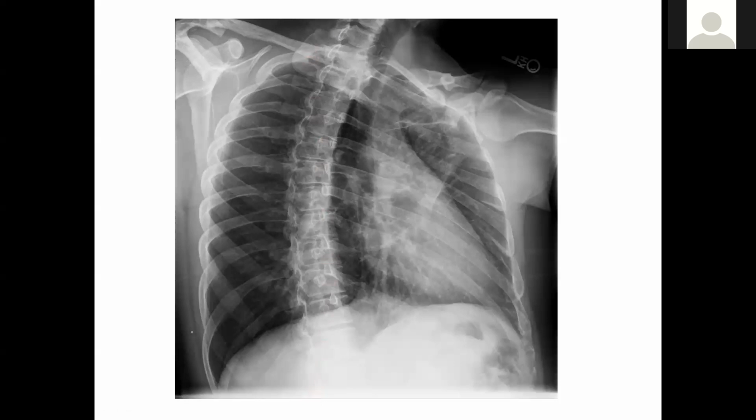So what can we see here? Rib number 1, 2, 3, these are all posterior ribs. Where they're curling around, you're looking at it on end here. On the foreshortened side, you also have posterior ribs and then curling around. So you're looking more at these axillary, the anterior side on the foreshortened image. So here's rib 1, 2, 3, 4, rib 5 curling around to here.